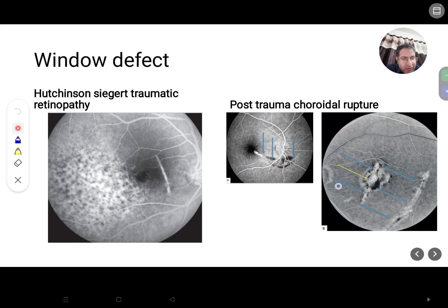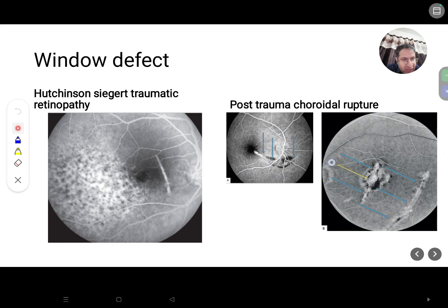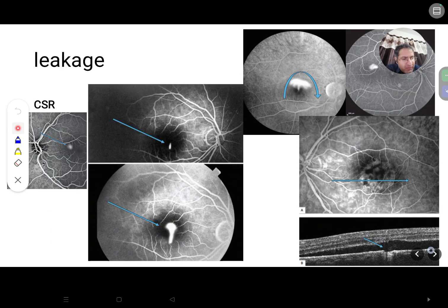This is the other example of the choroidal rupture. In which phase of the angiography is this taken? AV phase. This is the other example in the early AV phase. Arteries are filled, laminar flow in the veins in the early AV phase. We can see the choroidal hyperfluorescence, and along with that there is a hypofluorescence indicating some hemorrhage. And what does this yellow arrow point to? Some membrane occurring in this choroidal rupture, which can be leaking, and in the late phases this might leak out.